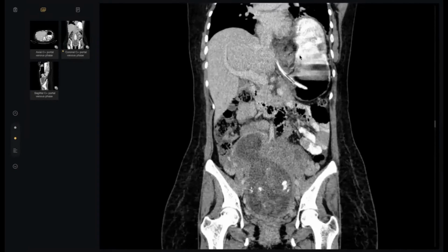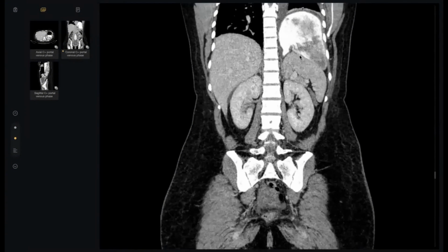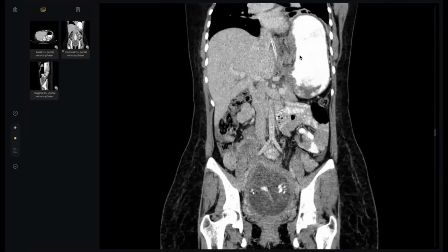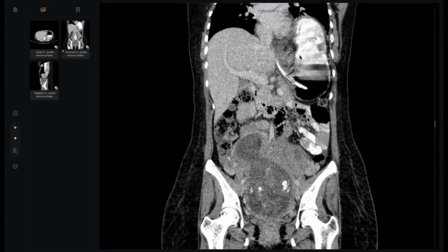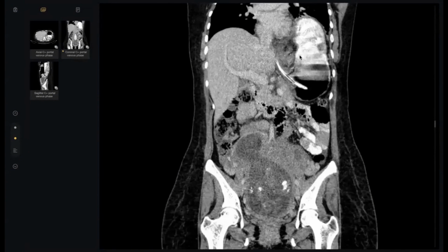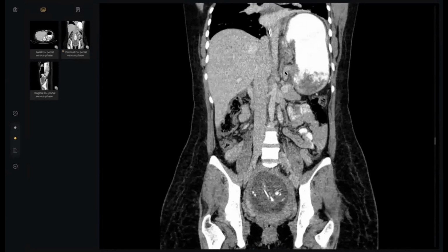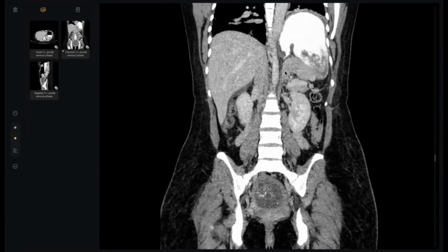So what is the type? So it is mesenteroaxial. Very easy. I will give you one clue to differentiate both types of stomach volvulus. Look at the cardia. Where is the cardia? This one, the gastroesophageal junction. Look above it. Is there any pylorus? Yes, doctor. So mesenteroaxial.